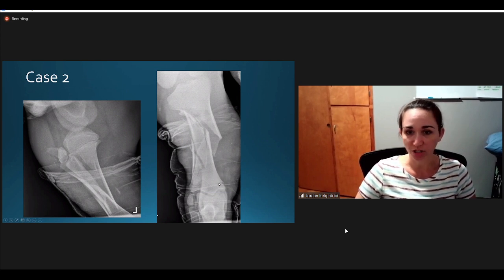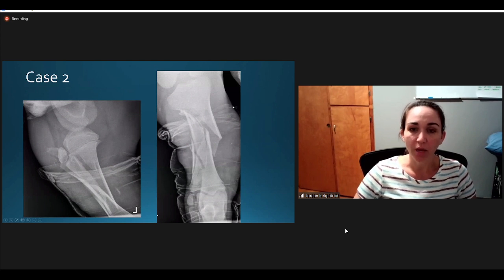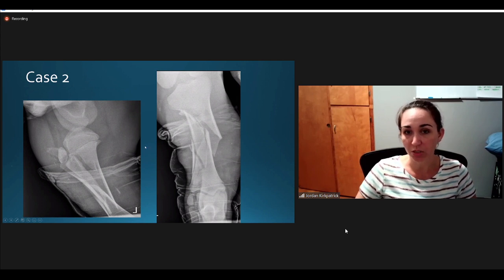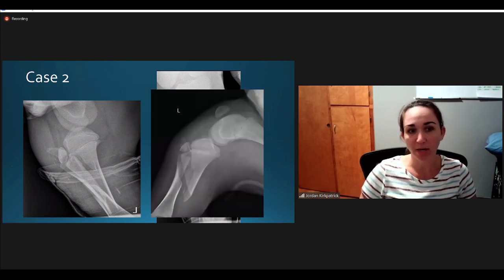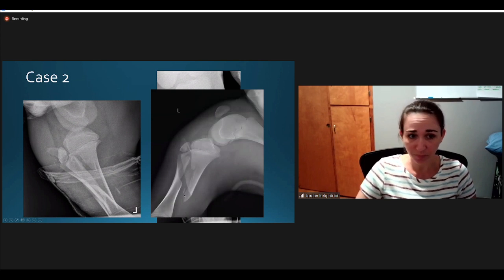And the fracture became worse because it wasn't stabilized appropriately. The other reason this is unfortunate, just putting the bandage on from essentially the stifle all the way to the ground without a splint basically just made the leg heavier, and it acted as a pendulum, which propagated fracture lines. So just so you can see, these are the radiographs that they're referring sent.